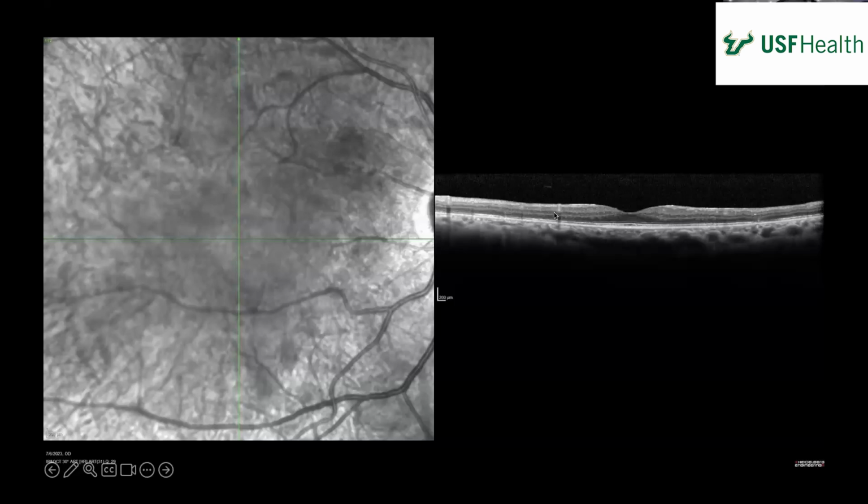This one, right? What is that, the vessel? This is a vertical cut. See, the line is greener, more green, and the arrow's at the top. So the top of the arrow corresponds to this over here. If you look at this little one and this little one that's shadowing, those are normal. Those are vessels.